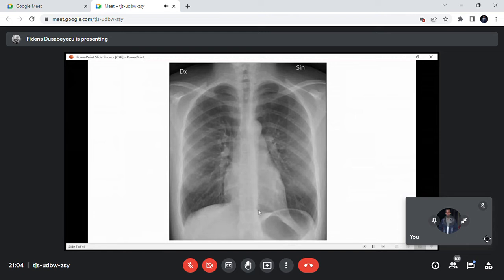This is the left ventricle. Part of the left atrium is here. This is the right atrium. The right ventricle is in front normally, because of the oblique configuration. So the right ventricle is normally anterior. You cannot see it in front of you. Okay. So those are the structures we have talked about.